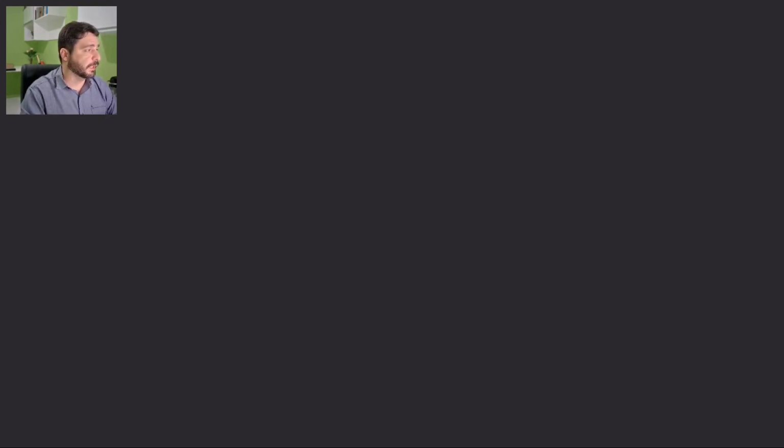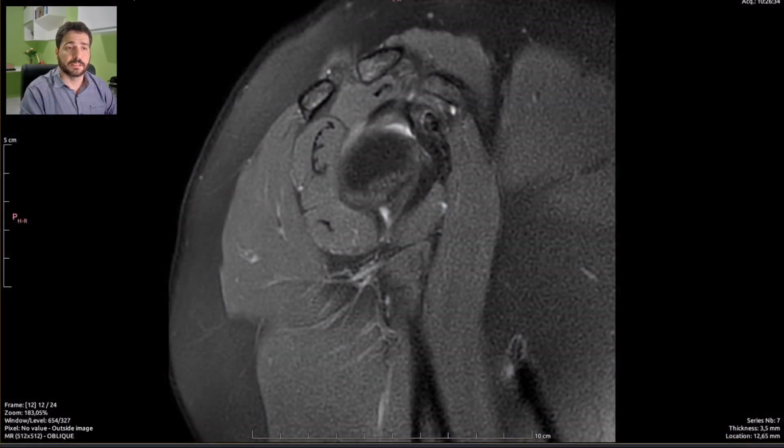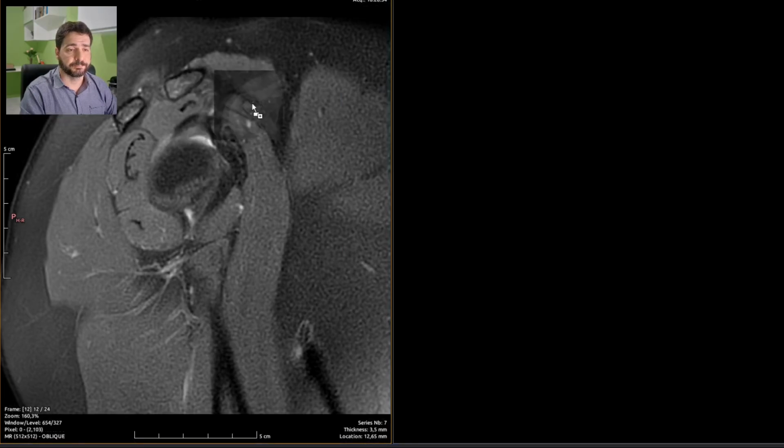She is 48 years of age, and I'm just copying and pasting my template, of course. Not that dumb. I'm not going to write every single normal finding. I have a template. Let's open it up so you guys can see all that I see.